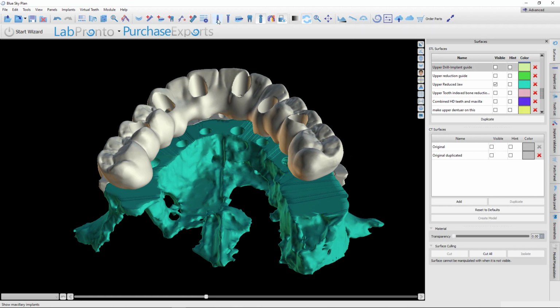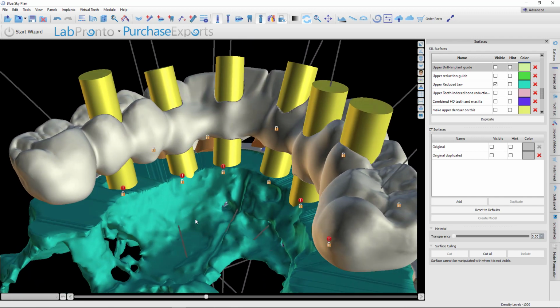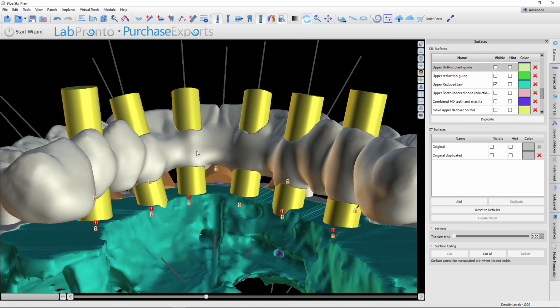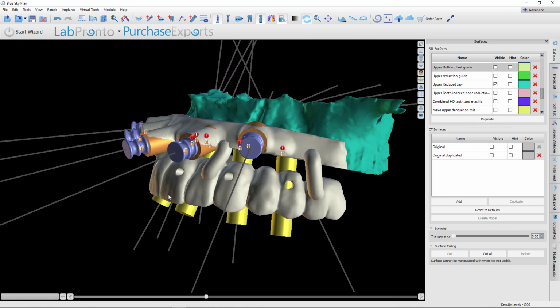All right. Notice where the implants emerge. So everything is pre-planned. So if you line up your implants, you put your multi on where it's supposed to be, then you know your cylinder is going to be emerging right through here. Now the straight ones, that's easy, right? But the angled ones are what gives you a problem. So we've tried to inflate this to make this as strong as possible. We've added a lot of bulk to the lingual. The buccal, you kind of need to leave it where it is for aesthetics sake, but this is going to make for a really nice emergence.